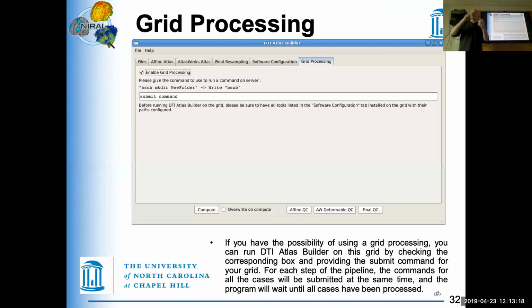And what you would do is, rather than resample the image twice, you would actually combine the deformation fields. We have a tool that lets you combine the deformation fields. So while you're creating this two-step atlas building, you can still end up with one deformation field that gets you from the individual space to the atlas space.